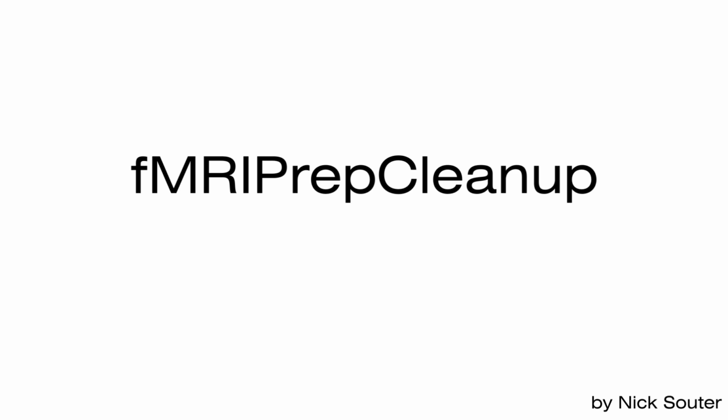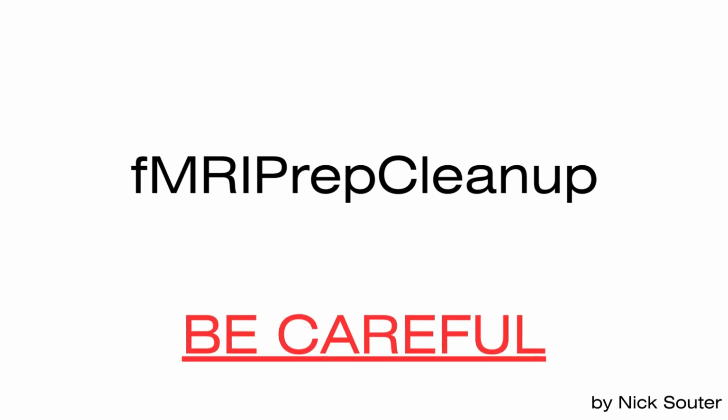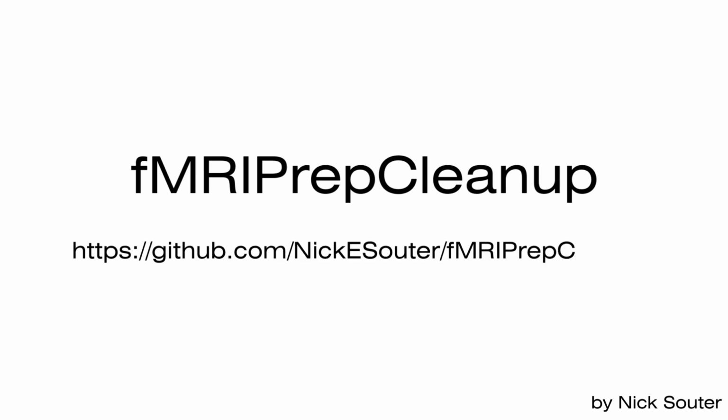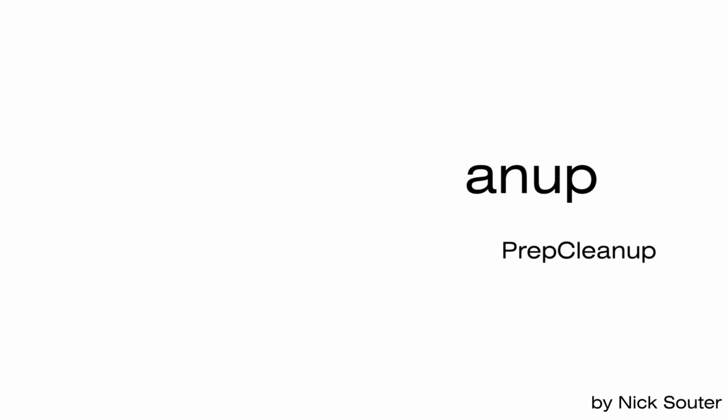As I'll say a couple times, the script does present a risk of accidentally deleting important files if not properly used. We've introduced a couple measures to stop this from happening though, so please do watch through the whole video or read the GitHub README file in full to learn about them before jumping in.